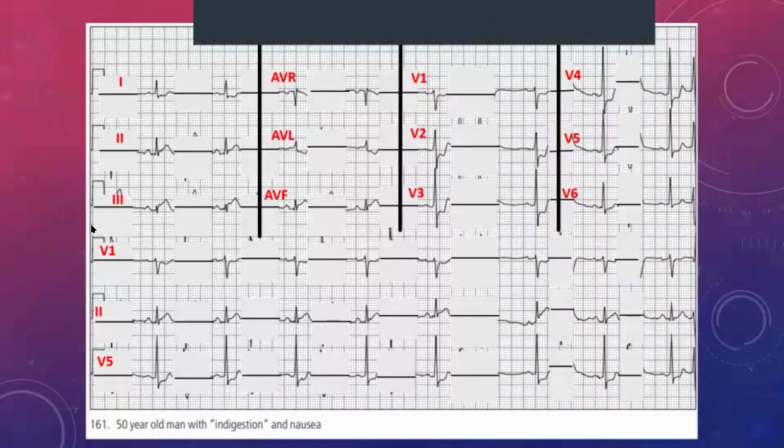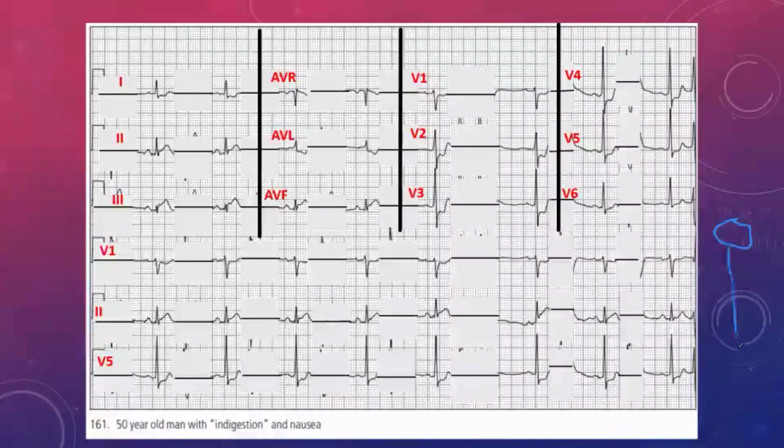Let me just do it again. I think it will serve us better. I'll try and draw a better stick figure this time, but please don't laugh at my drawings. I know they are terrible. Let's just get these here, just so that we can have a look at our limb leads and see what we can figure out from there.